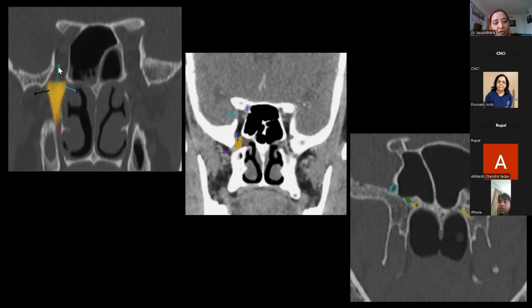inferior orbital fissure. Okay. Now, how do you trace your foramen rotundum and Vidian canal? This is always a problem. So how do I teach my students? You see this McDonald's M. You look at your nasal cavity, keep scrolling behind till you see this bony structure, and I call this McDonald's M. When you get a McDonald's M, these are its ears. Come to its ear, you will find the Vidian. Come diagonally opposite, you will find the rotundum.